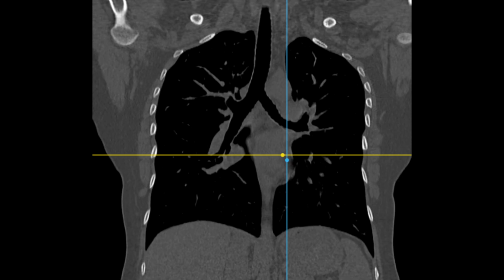Nonetheless, interpretation of CT images always requires multiple views, axial, sagittal, and coronal slices, along with clinical correlation and radiological expertise. This image serves as a clear example of how CT imaging provides detailed anatomical visualization of the lungs and thoracic cavity. It highlights the branching airways, the expansion of the lungs, and the structural framework of the ribcage, all of which are essential for evaluating respiratory function and identifying potential pathologies in a clinical setting.